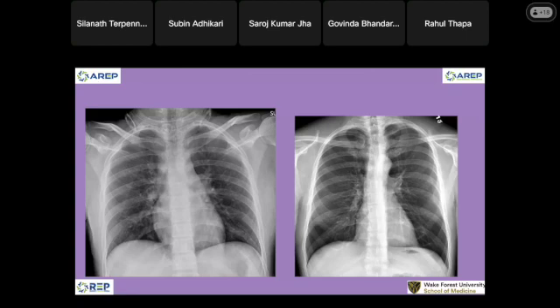Sometimes you pick it up, sometimes you don't see it. It depends on the lighting at the time when we do the chest radiograph. We will not see it all the time unless it's really big. The small one can move up and down, but the big one will always be there. Like this one is pretty big.